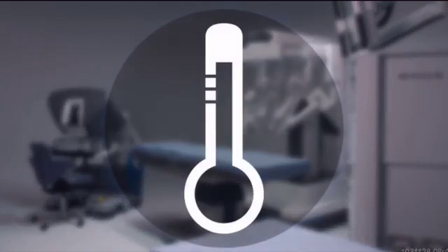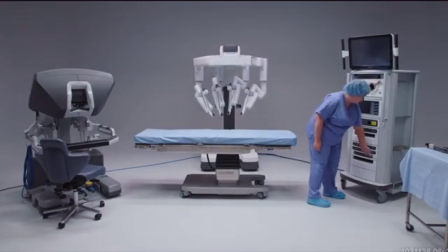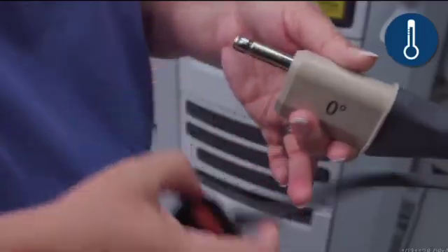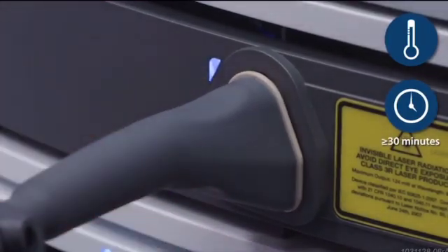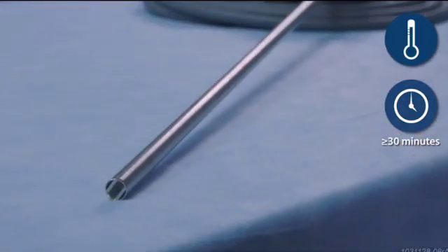Consider increasing the operating room temperature a few degrees to minimize the difference in temperature between the endoscope and the OR environment. Also, with the da Vinci system powered on, begin warming the endoscope tip by connecting the endoscope to the endoscope controller at least 30 minutes prior to the start of a procedure. The illuminator does not need to be turned on during this time.